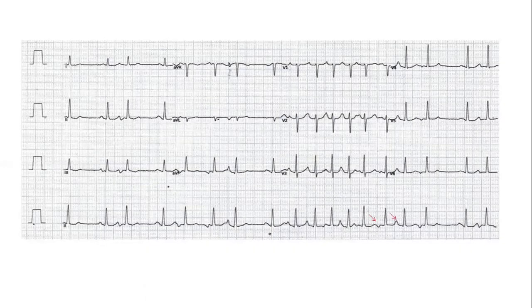Another ECG, you have sinus rhythm, PAC, another PAC. So these are PACs, but this is a run of irregular narrow complex tachycardia where you have one P wave, one P wave. So you have at least 3 different morphologies of P wave. The PP interval is different, the RR interval is different, but this is not completely irregular. So this is not AFib, this is MAT.